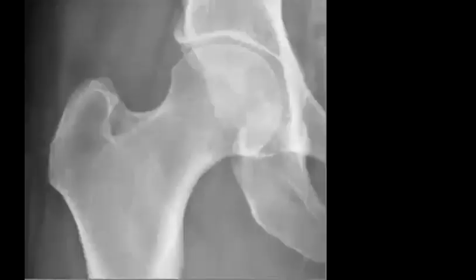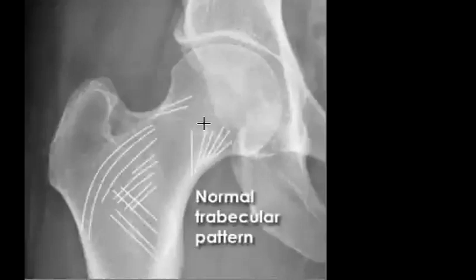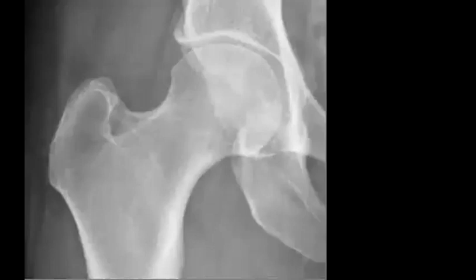And when you check the femur, for example, here, you should check for the trabecular pattern. So this is the normal trabecular pattern. Any distortion in the trabecular pattern will make an abnormality, when it is present, very obvious. Okay, so this is like an introduction.